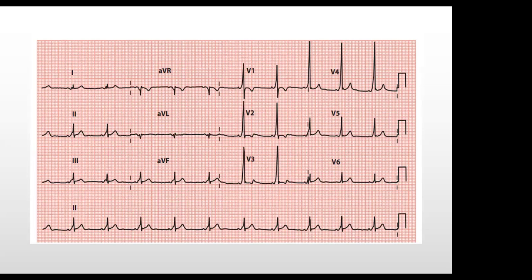WPW. Okay. Yes, sir. Any other comment to this? Good evening, Dr. Percy. How are you? I'm fine, thank you, sir. I'd rather say WPW pattern because there was no history given. You call it syndrome when the patient has symptoms in association with the ECG findings. So being no symptoms yet, I'd rather call it a pattern. Okay, WPW pattern.